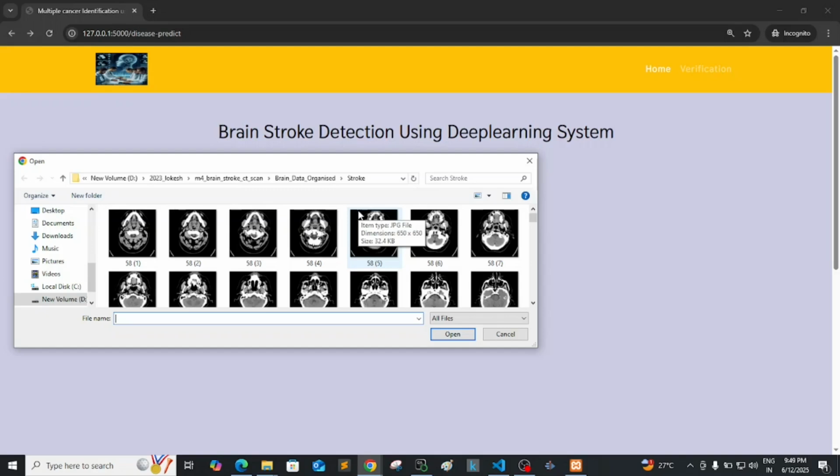There are many more things here. So login is there, registry is there, admin login, patient login, and patient data will be updated by the admin. Admin can enter only the patient ID to get all the information, and the treatment recommendation and what the causes are. All the information will be provided here. So this is a complete web application.